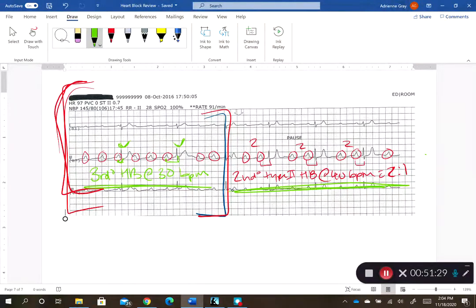And what that pacemaker will do will ensure that, if she falls into one of these 2nd degree type 2 or 3rd degree heart blocks, it'll start pacing her heart for her. So she doesn't get bradycardic or possibly go into that ventricular standstill and pass out, possibly go into a cardiac arrest. But I thought it was a real cool patient. That's why I want to show that example. Kind of shows all those different types of heart blocks besides the 1st degree all in one strip, which is kind of cool.